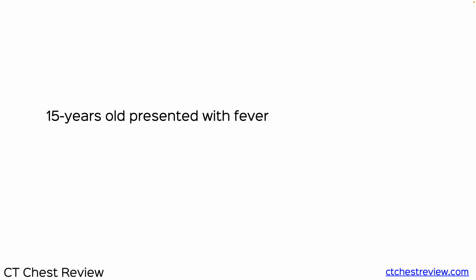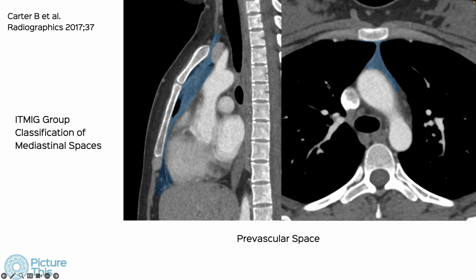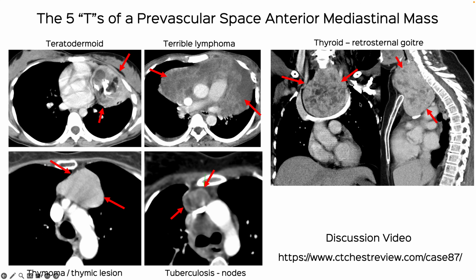Now, this 15-year-old presented with fever, and here's a mass with multiple areas of necrosis in the prevascular space, which here I've depicted in blue.